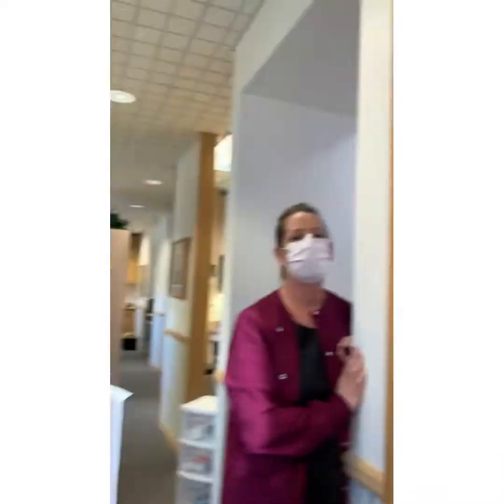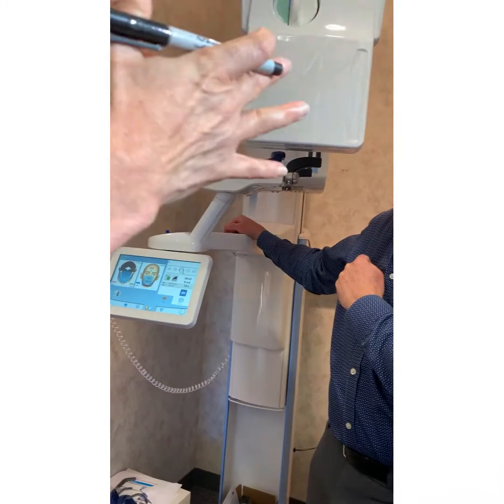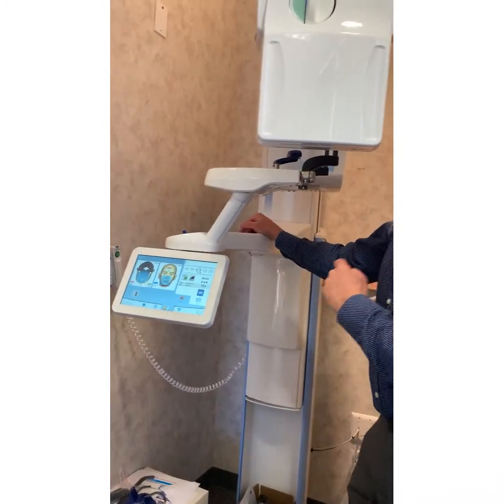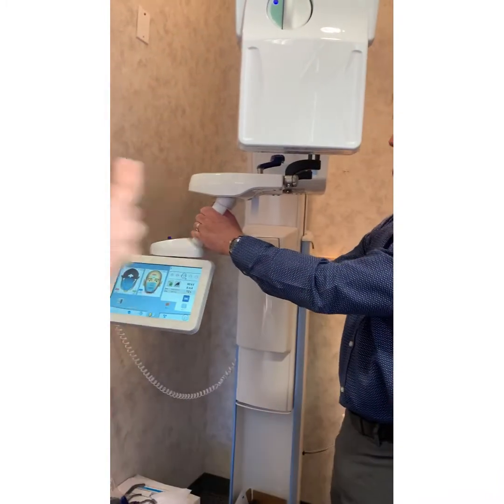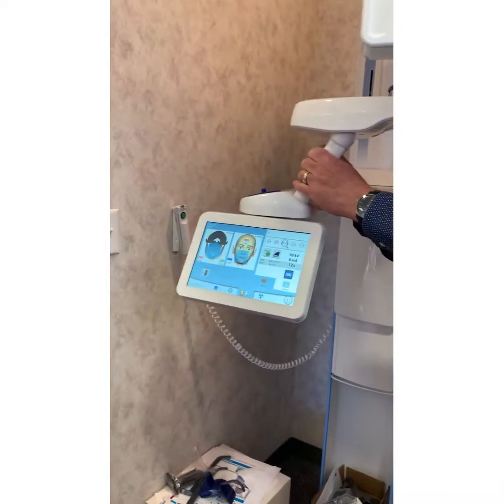Right. And I think patients are leery about stepping into this when it was just a panel. Now, if it's so close to the wall, I think they need to feel like they're walking in without all the clutter. Yeah, because when I went, I just went like this. Just gonna push it out of the way. Is that wrong? Is that screwed up?